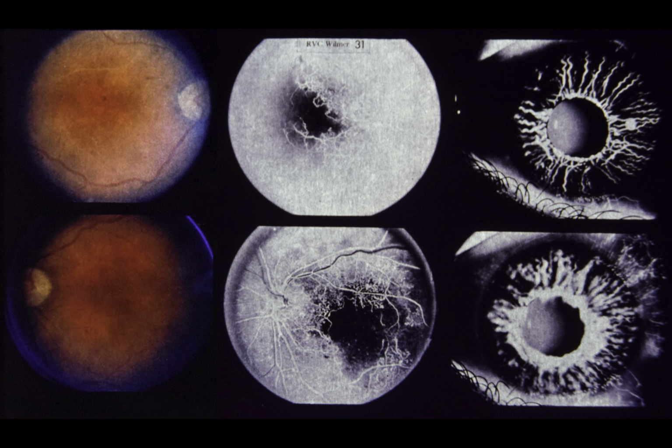In patients with diabetic macular edema, capillary non-perfusion in the macula often indicates a poor visual prognosis with or without photocoagulation treatment. In patients with proliferative retinopathy but no macular edema, capillary non-perfusion in the macula is a less reliable predictor of visual acuity. Note that retinal capillaries supplying nerve fibers in the papillomacular bundle are not disturbed in this patient.